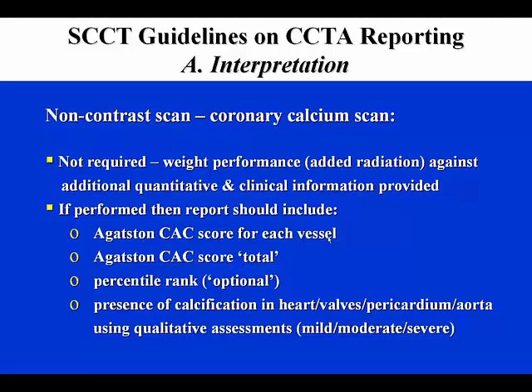This analysis should include evaluation of the Agatston coronary calcium score for each vessel, the score in total, the percentile rank, and a notation of the presence of calcification in other extracoronary structures such as the heart, the valves, the pericardium, and the aorta using qualitative assessments such as mild, moderate, and severe.